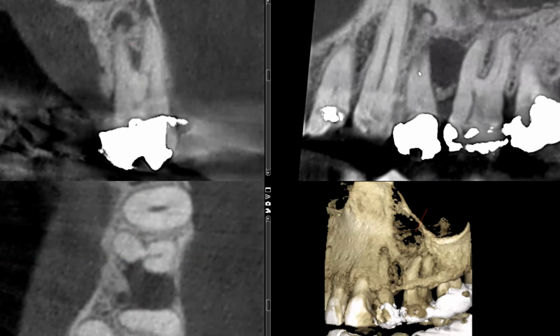that's the lateral canal. Anyway, what that tells me is that because I see a lateral canal, or if you want to call this accessory canal, I'm not sure what's the more appropriate term, I think lateral is more appropriate.